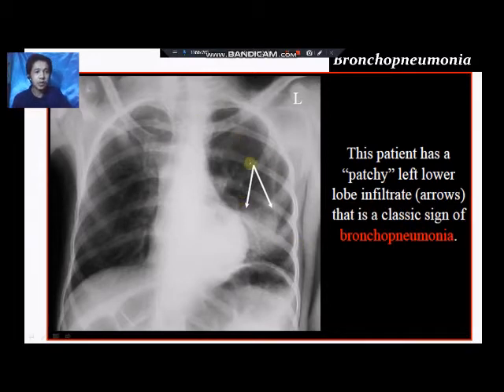So again, di ba, the lungs should appear as black, but in this patient, we can see that the radiographic appearance of the lungs is somewhat with consolidation, with patchy appearance, or whitish appearance. So supposedly, di ba, they should all be black, the density should be uniform, but because of the condition of the patient, there is fluid in the alveolar sacs and some of the bronchus of the patient, so that's why they appear as white. So again, fluid appears as white.